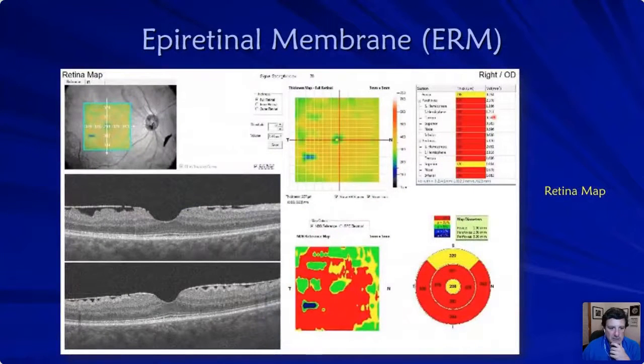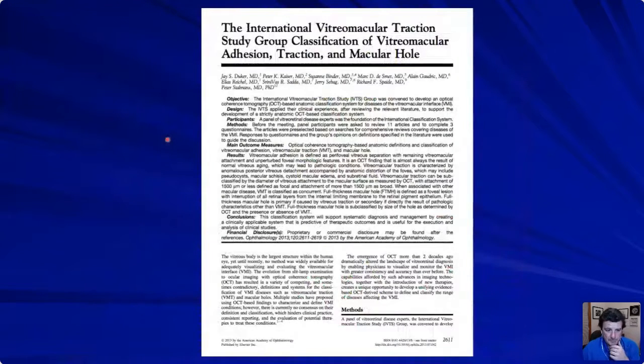And this is just another scan, again, of an epiretinal membrane. Again, looking at the macula area from the external limiting membrane to that ellipsoid or inner segment, outer segment, to that RPE complex. Again, I would not expect a problem on Snellen acuity. On contrast sensitivity, that could be different. But on Snellen acuity, this patient should be 20/20 in refraction. And look right here. What do you see right here? You can see the PVD that has created all of this, in a sense, by cracking that internal limiting membrane.